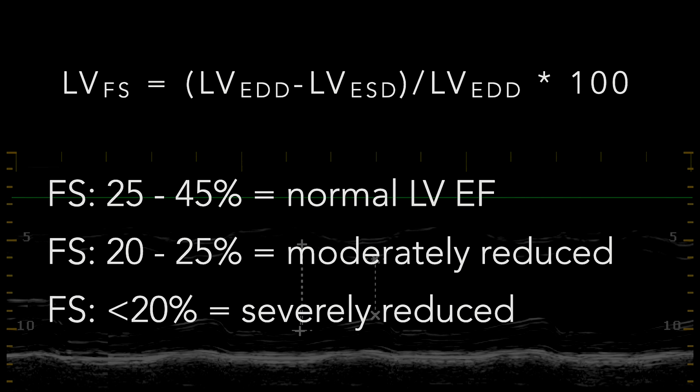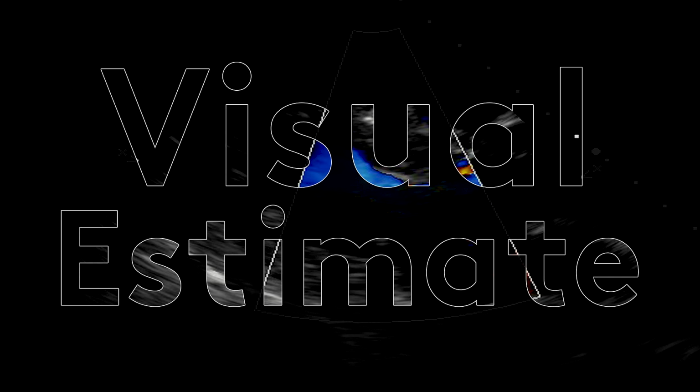But today, what I want to do is really dive into this third technique. And this is going to be probably what we do most of the time, right? The first one that we're going to actually utilize, and then probably the fastest one, as we're looking at how to estimate the ejection fraction using, in this situation, the visual estimate technique. And this is where I found that for the most part, we do a great job, right? And then there's an occasional case where our estimations kind of break down. And hopefully in the context of this lecture, we can go through some specific tools that we can think through as we're doing this visual estimate technique to really improve the quality of that LVEF that we're trying to assess.